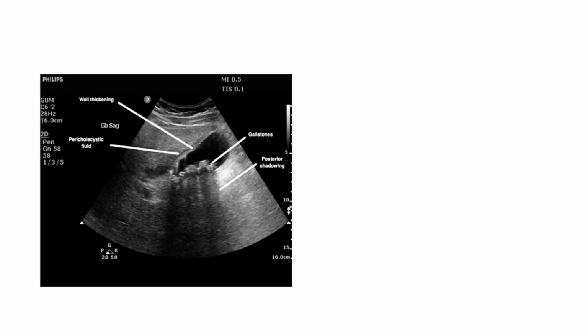This is ultrasound of cholelithiasis, that is gallstones. As you can see, these are the gallstones. This is the posterior shadowing, and this is the wall thickening.